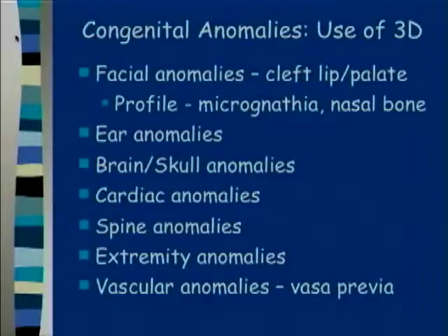In the brain, we're using it more and more as a troubleshooting tool and trying to measure different structures and figure out whether they're normal or not, and I will show you several of those types of applications. People are talking about 3D ultrasound for cardiac anomalies, but in my hands, we use it predominantly for teaching how to get those outflow tracts, how to understand the three-dimensionality of the heart. And we are just beginning to use it to look for actual anomalies themselves.